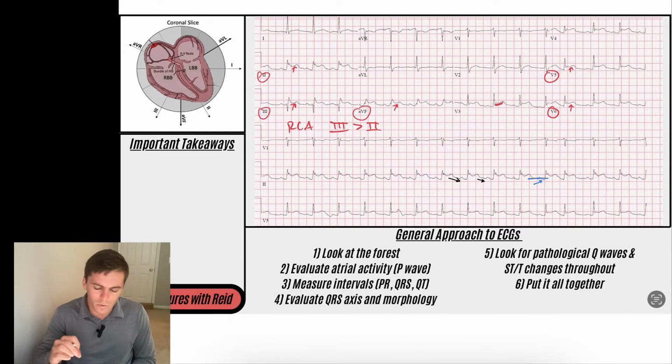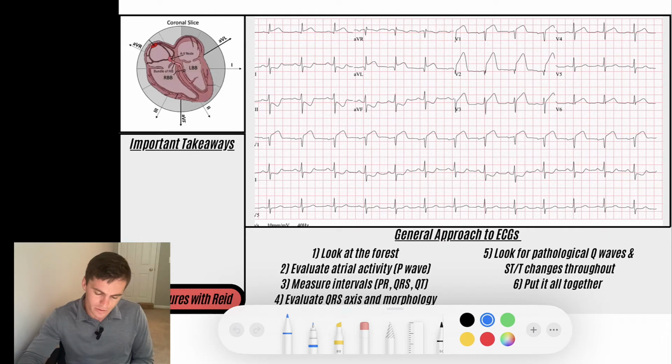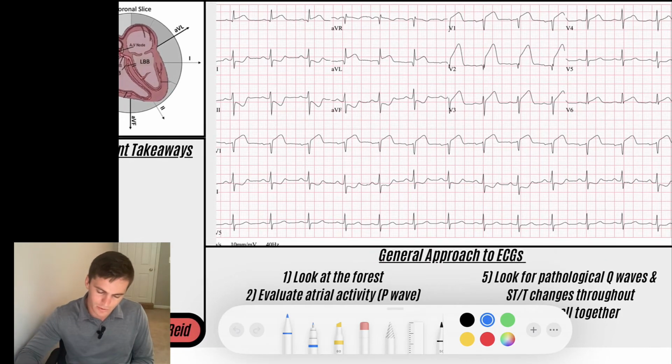I wanted to show you quickly an example of a myocardial infarction and how it's different. So here is this. I want you to notice that we have an anteroseptal MI here.